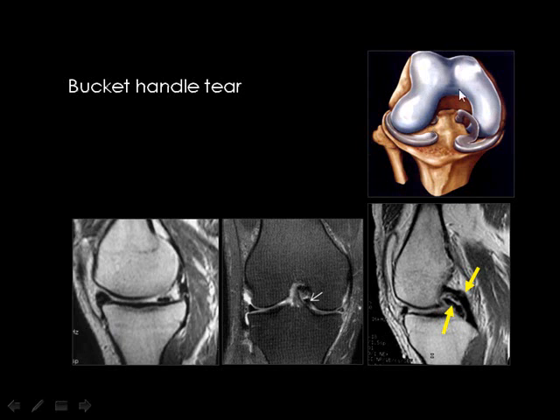And in the intercondylar notch you find the cruciate ligaments, the posterior and anterior. Okay? The posterior is a little bit medial and the anterior is a little bit lateral. Then if you look at the level of the posterior cruciate ligament, you will see the missing part of the meniscus. Look at here.